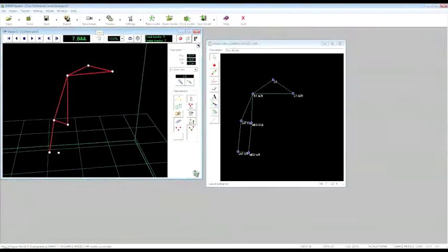And now we can move our 3D view, or we can click on play just to check that the trajectory assignment is complete over the entire duration of the acquisition. So now I have voluntarily created some gaps in the trajectory, because after that I want to show how you can perform any interpolation within the trajectory.